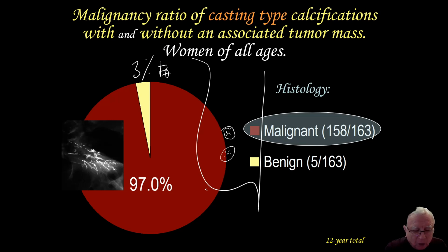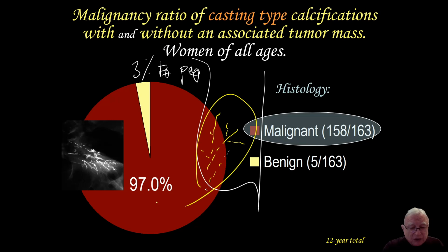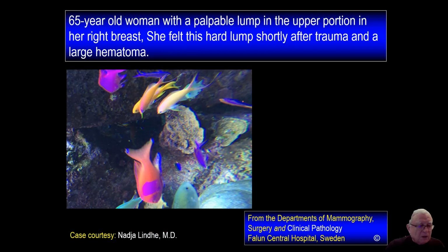Likewise, papilloma can look like this. But then there is the third one that can really mimic diffusely scattered casting type calcifications localized to one lobe in one breast, and then your anxiety level is going up, as it did in our case.